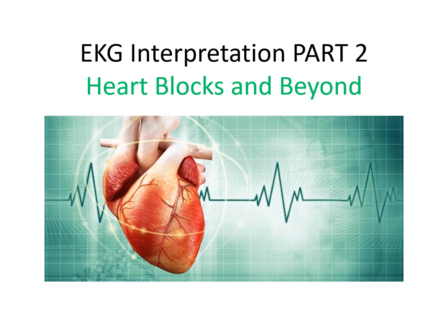Okay, welcome back to the second part of our EKG interpretation lecture. We're going to continue where we left off on heart blocks. We're talking about atrioventricular heart blocks and beyond that as well. We have more content that we will go back to and address in a little bit more detail than we previously mentioned.